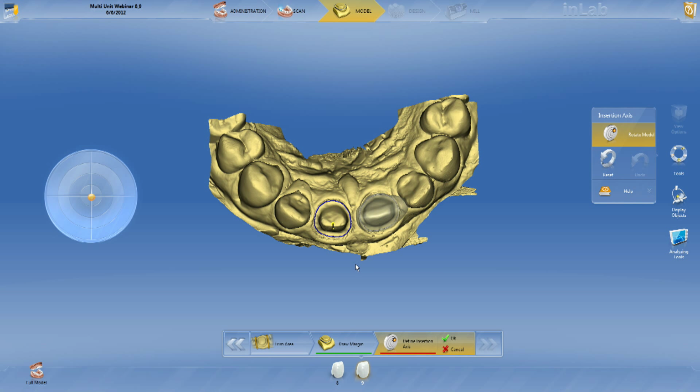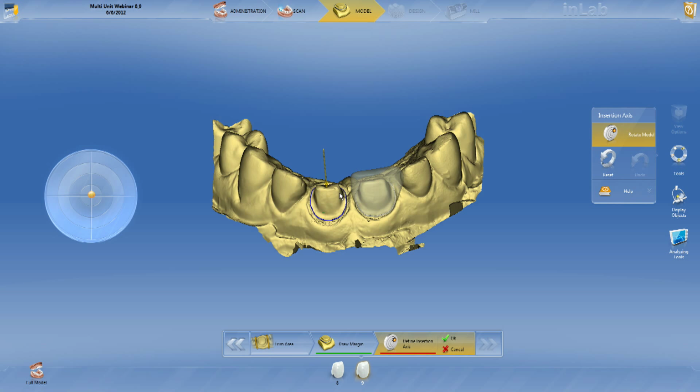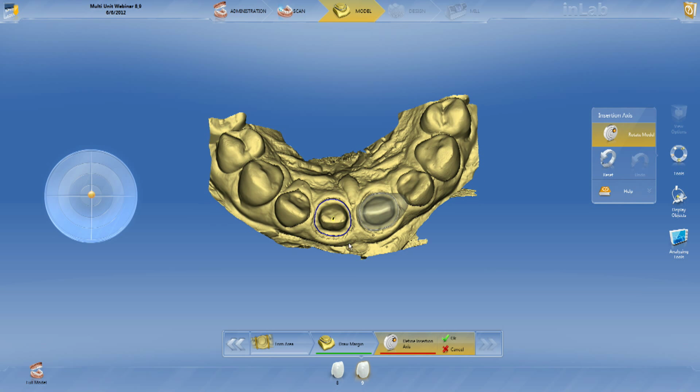Again, positioning. There was a key. Because of time restraints, usually I like to trim all my stuff. So we, of course, see yellow if there's going to be any kind of undercuts or anything like that. But I think that's a pretty good position right there.